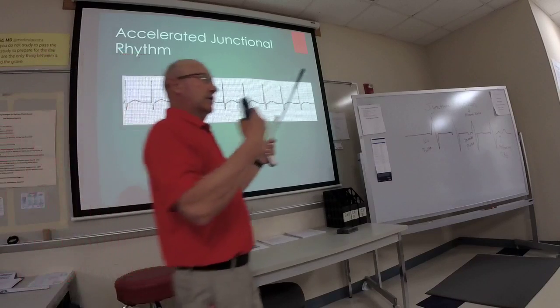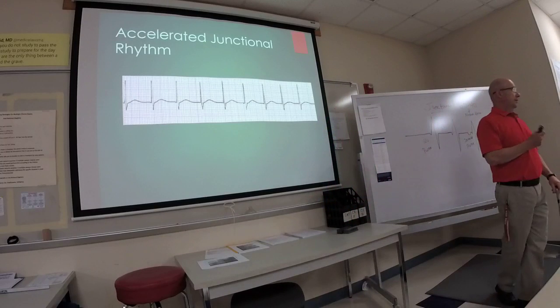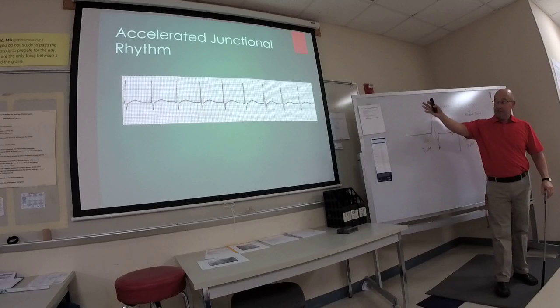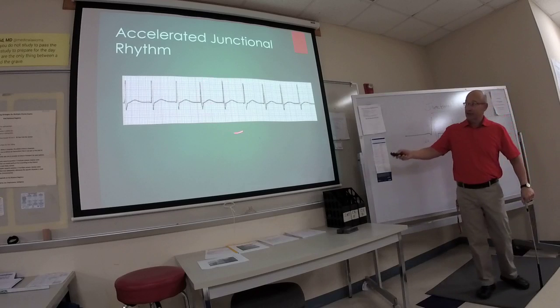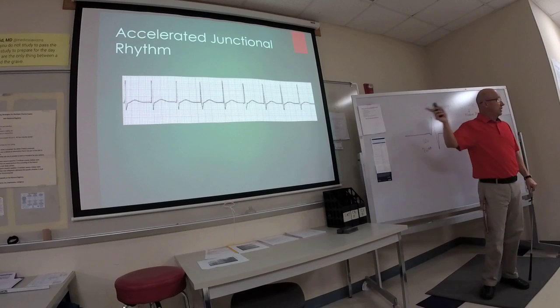Well, yeah, I know that. But what, cardiac-wise, would make it irregular? Like if there was another block, something different. Yeah, a little section. If all of a sudden there's a PAC involved there, right? So right in the center here, envision a P wave right here, okay? So that would make it irregular. That would be a PAC.